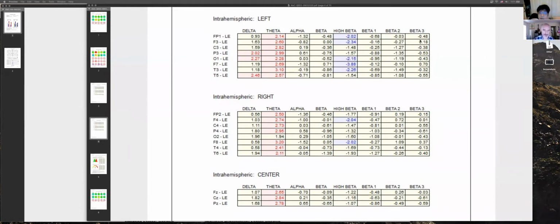Wait, so beta is minus. That's below average. Yeah, alpha is also below. Yeah, the alpha is the speed of processing, but the beta is actually the processing itself. Okay. So some places it's above average, other places it's below average. The mix of feeling pushed and feeling depleted.